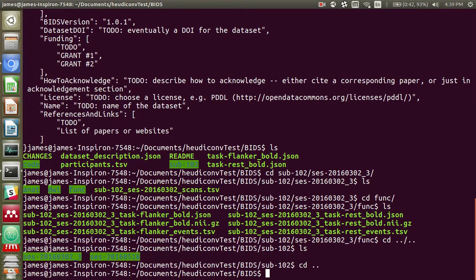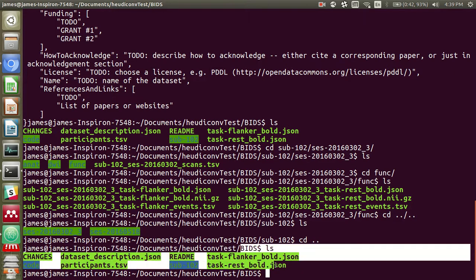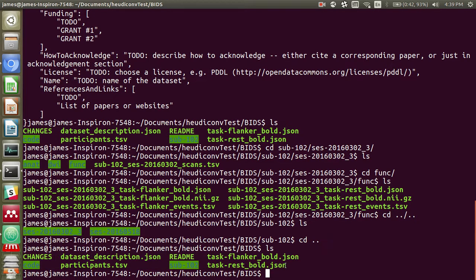So with that, you should have the basic tools and hopefully feel a little bit less intimidated with Heudiconv and feel capable of generating your own heuristic file, whether it's as simplistic as mine or as advanced as needed to accommodate other situations in which you might have failed scans that were still uploaded, or several runs of a certain scan type sequence that you would like to more intelligently collect. Yeah, you can do it as complex or as simple as you want with the heuristic file.